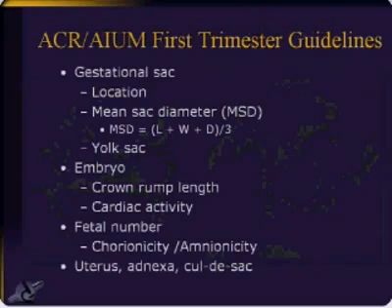All right, so in summary, I just want to leave you with the fundamentals of the first trimester ultrasound. It's important to know what we have to document and what the normal development looks like. And if you have that firmly implanted in your minds, then I think it's very easy then to look for abnormal development.